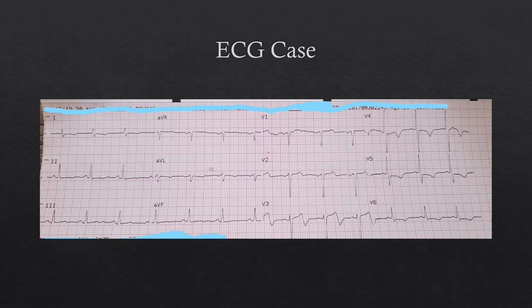When you look at it, you'll see that abnormal T wave presentation that is popping up in V3 and V4, V3 especially. So this presentation, when you see this ECG in the presence of a patient with ACS-like symptoms that have resolved prior to the ECG or remarkably reduced symptoms, that is indicative of Wellens sign. So that pattern right there is something that you want to remember. And the scary part about this one is that it presents when the patient is pain-free. So why does that happen?